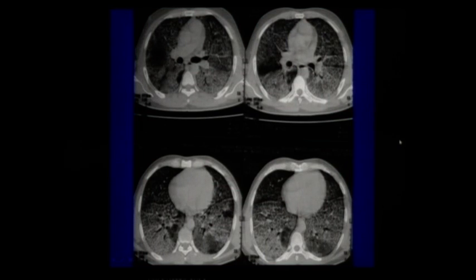This is another typical disease which you will diagnose with CT. What is that? If you look carefully, you will see that there is background ground glass haziness, and if you look still more carefully, you get what is called a crazy paving appearance, that is, a background ground glass haziness and interlobular septal thickening.